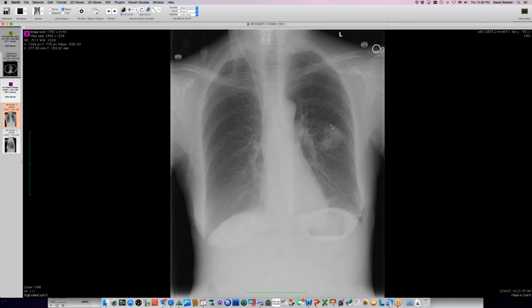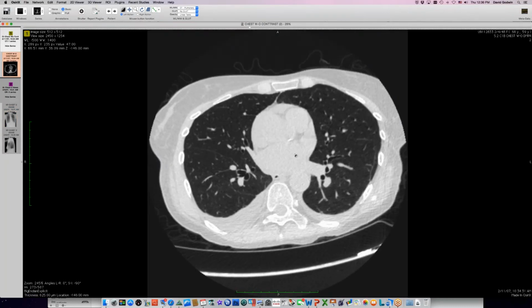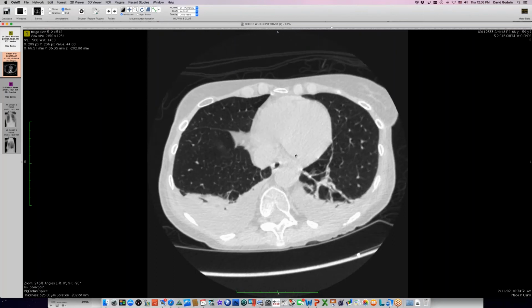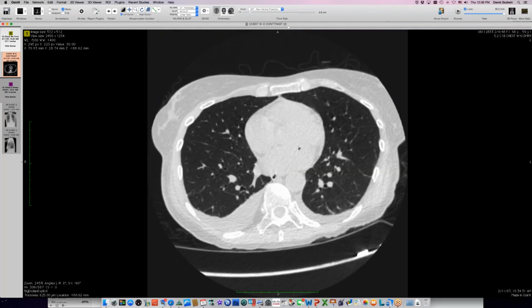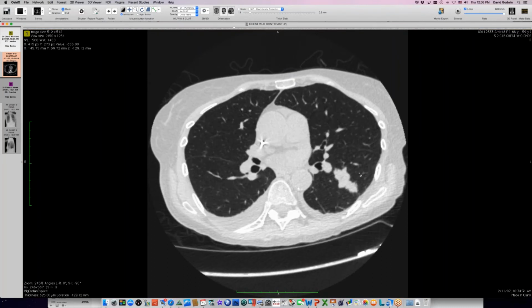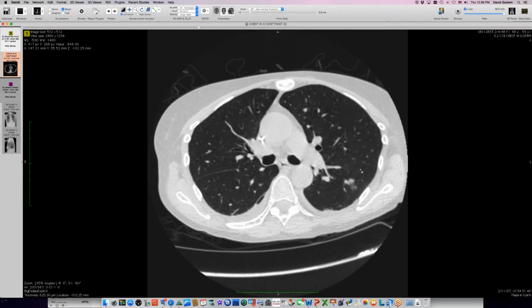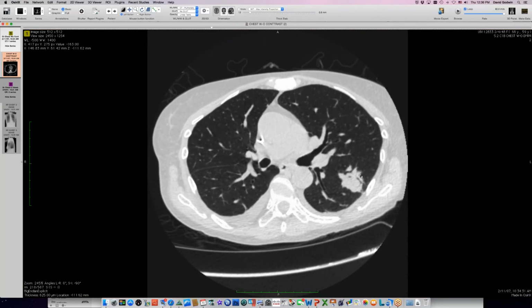So she came down with this lung nodule. I don't think this was symptomatic, but she did have this nodule. It was CT'd, and here's our nodule with some irregularity and some elongation and no cavitation. And this was resected, and it was Cryptococcus, and they identified this as gattii.